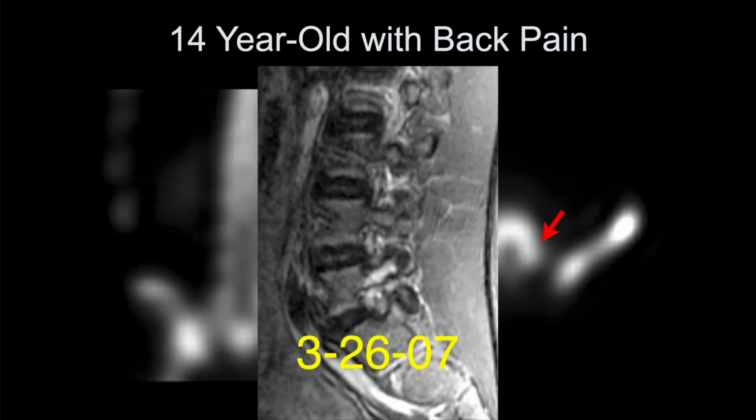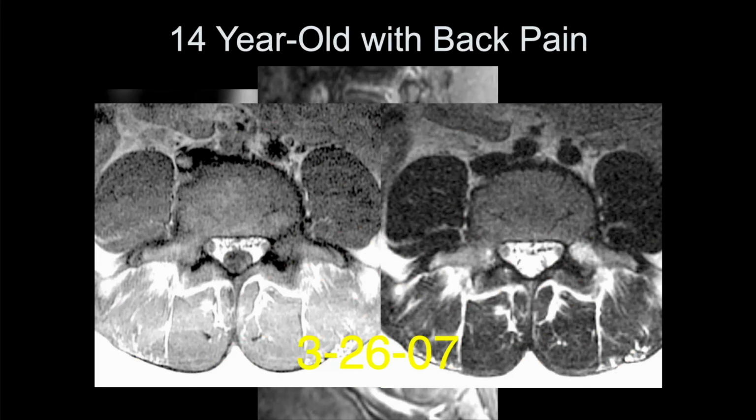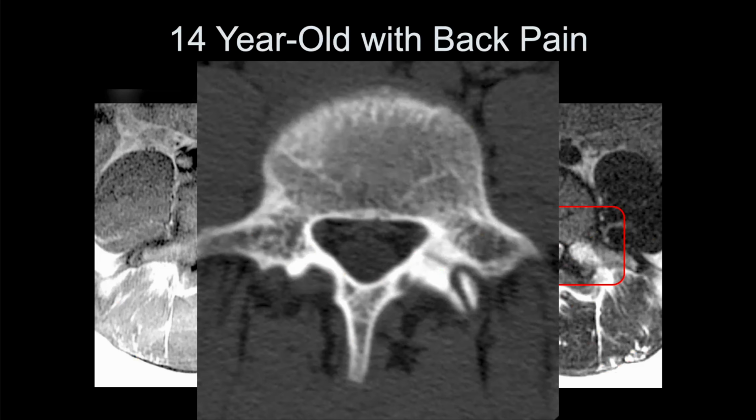So here it looks like there's some marrow edema in the pedicles. Yeah, in the pedicles there. Right. And here you can see the axial images. You can see a little bit of edema over here. Maybe a little low signal intensity coming across the pedicle in that location.